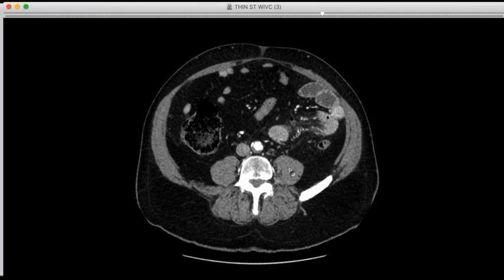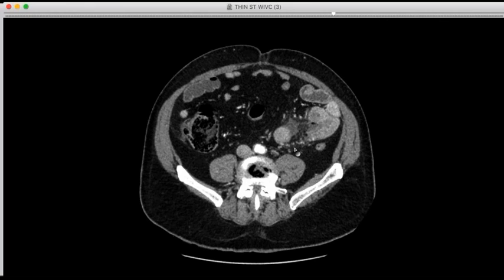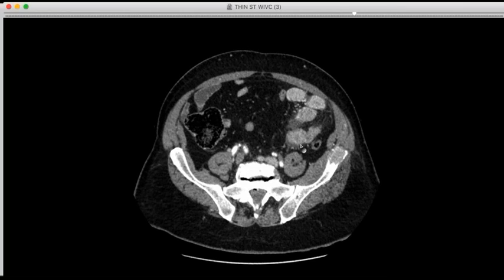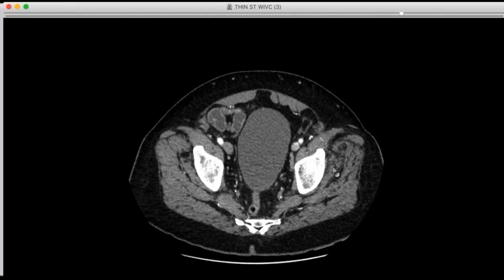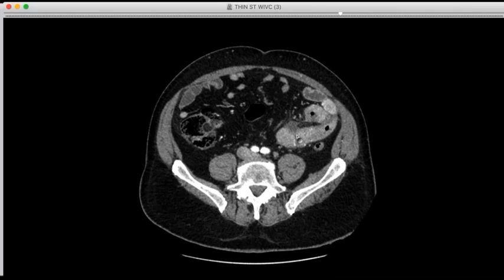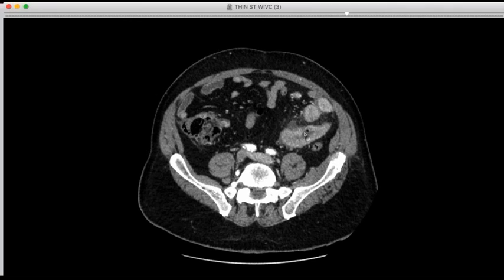And then further down, the small bowel here looks very unhappy. There's some fluid here, there's wall thickening, and then there's some extraluminal gas. So there's what looks like a contained perforation or a very small perforation, and probably a little defect right here in the small bowel wall. And then this lytic lesion in the iliac crest here. So clearly we have a metastatic malignancy and either a second pathology or one related. But the fact we've got these unhappy mesenteric lymph nodes, and this looks like a small bowel perf.